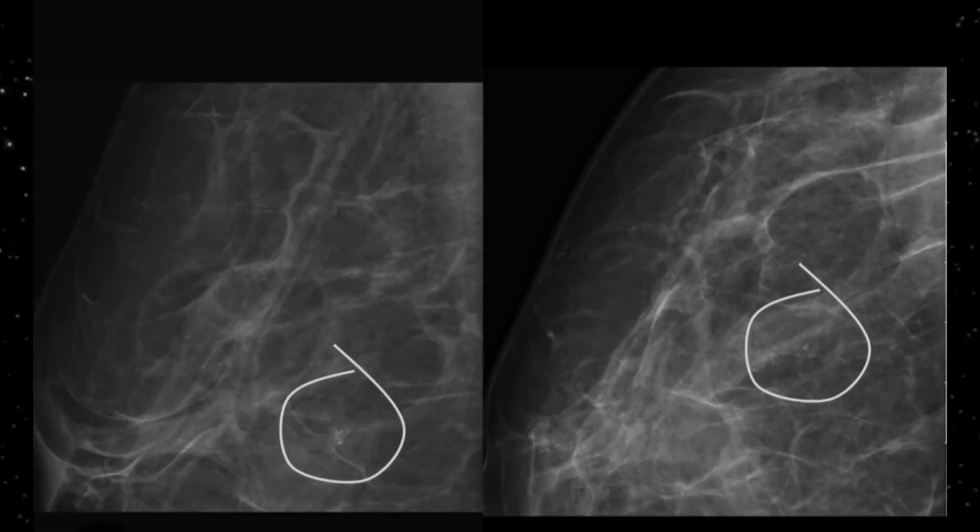Next comes another benign entity, that would be milk of calcium. Sometimes in fibrocystic changes there will be sedimented milk of calcium within the microcyst. This will appear the way you are seeing, surrounded by this circle. For that you have to have the CC view, where it would be a round smudge shadowing, or a lateral magnification view, a characteristic teacup sign due to calcium fluid level layering of calcific fluid within the microcyst.